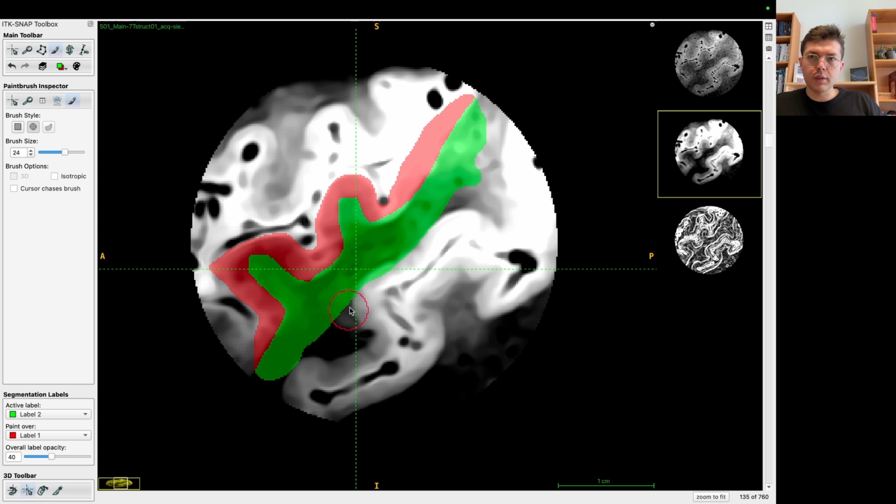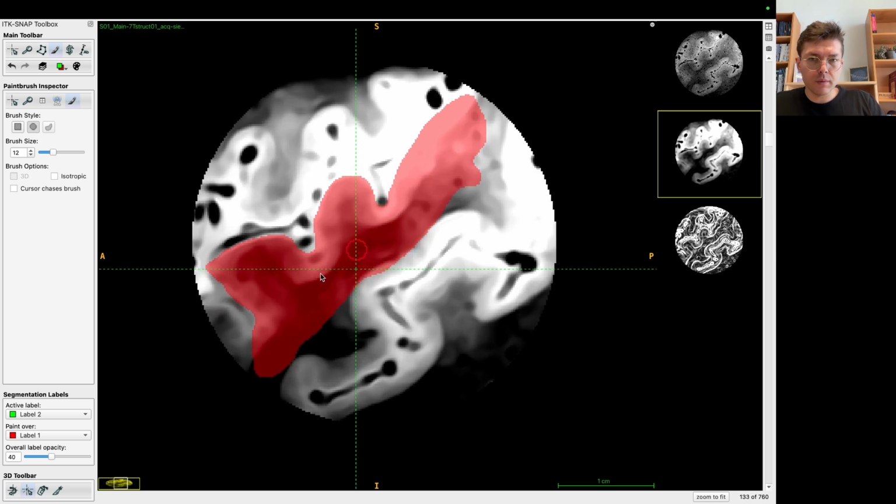Okay, now I will actually try a trick for the rest of it to speed it up. Now I was thinking about it. Just a couple of slices and let's see if it will work. I will do the skip thingy again, every third slice.